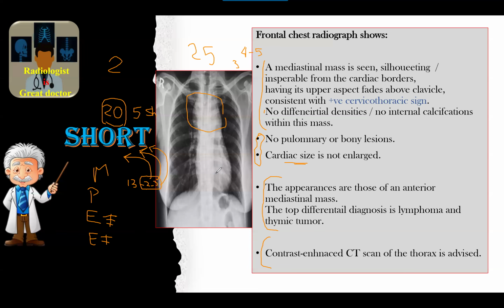A normal cardiac size is accepted. But what about if borderline? This term is better: cardiac size is not enlarged. If you want to say cardiomegaly, it's okay. Borderline cardiothoracic ratio, alternative words. Then summarize the findings in the form of a single sentence diagnosis.